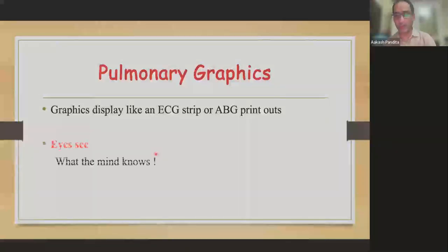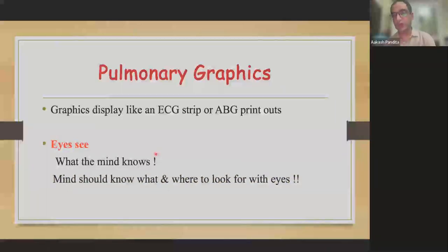We need to be very familiar with them. We need to know what to look for, which curve to look for, and what to look for in each curve. Then it becomes very easy to understand them, and they definitely help us to fine tune.